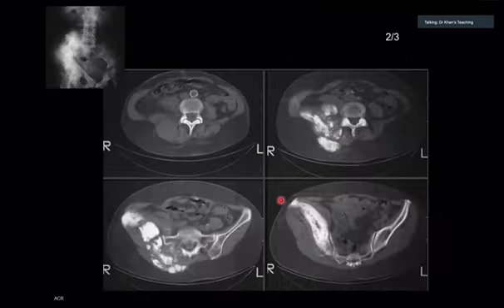The most common tumor, which is malignant transformation in Paget's, is osteosarcoma. And osteosarcoma is a bone-forming tumor, and that is why it has caused this sclerosis, and that ossification is projected here. So this was malignant transformation of Paget's disease, which can come in the exam.